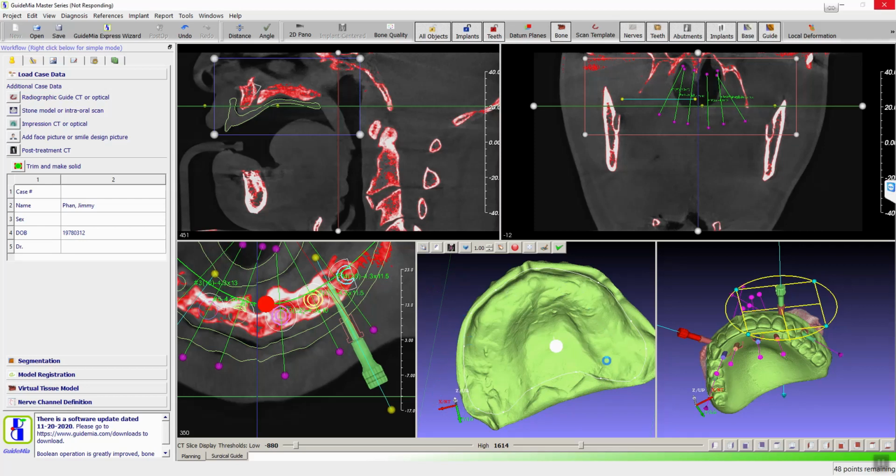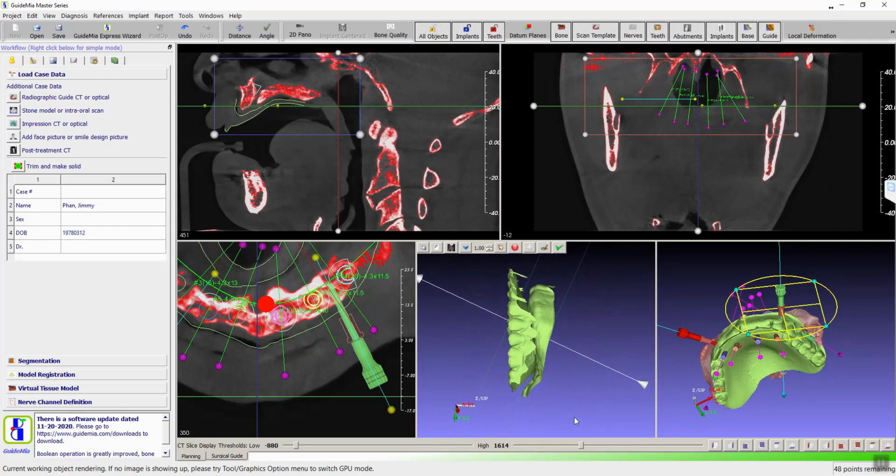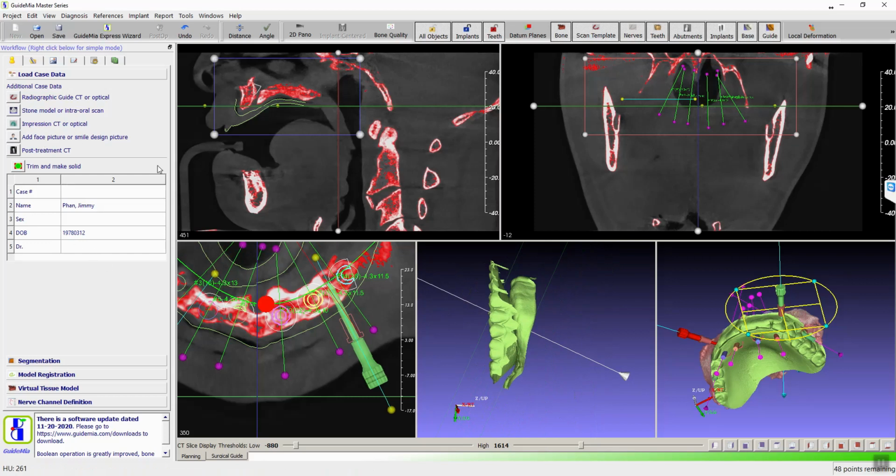So it's going to cut this piece. You have the tissue side and the occlusal side. Then we do one more cut, because right now they are about the same size. We do one more cut. So we do go here, make sure we don't actually hit the model. Then we have a small piece removed on the occlusal side. That should be fine.